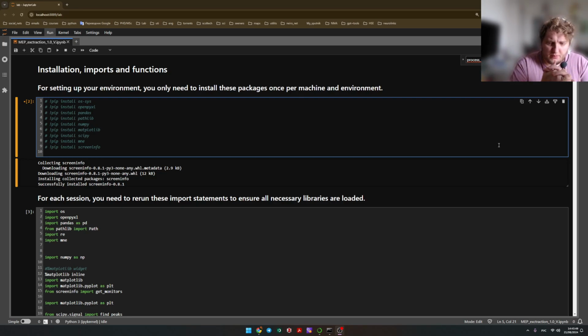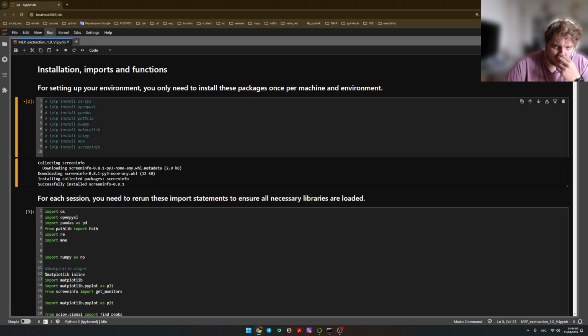So firstly, you will need Python and Anaconda. I suggest Anaconda, and also I suggest JupyterLab or Jupyter Notebook. It depends on what you prefer.